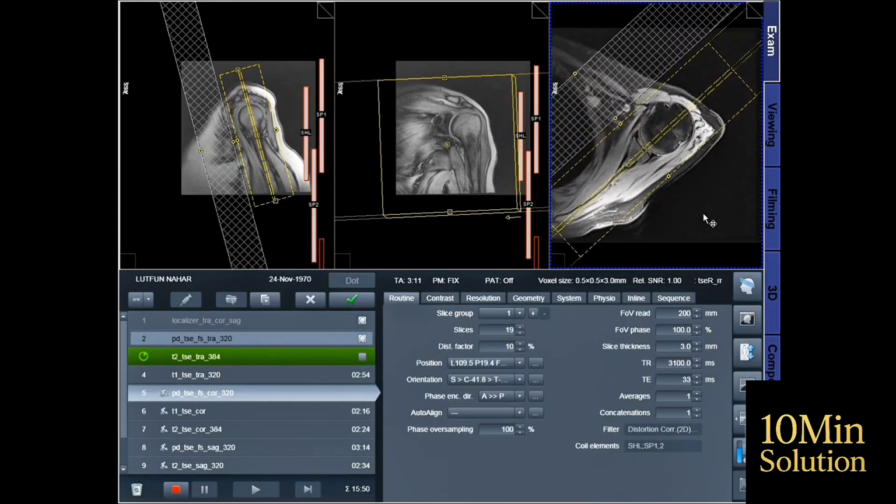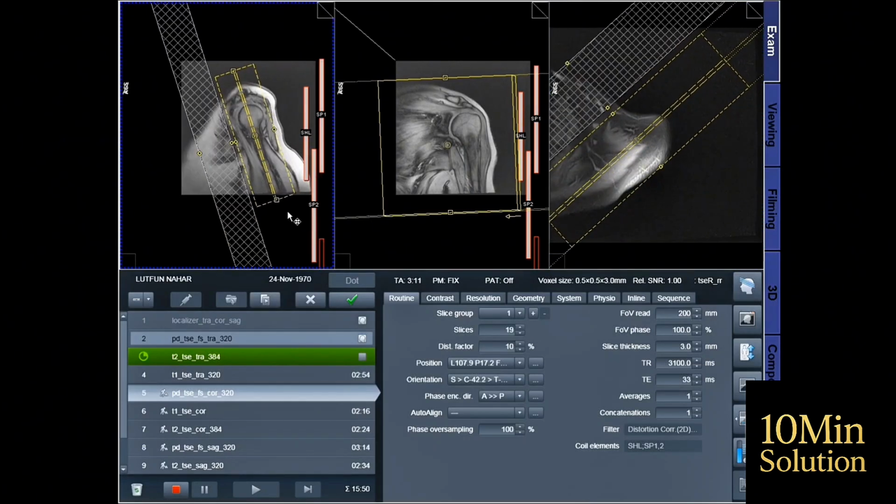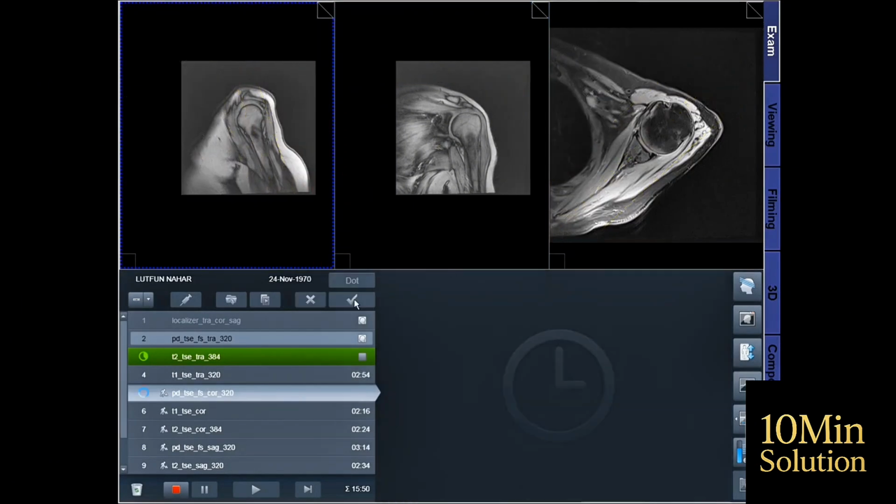So now, since we are doing coronal planning, if we talk about the theory, then it will be based on the axial and sagittal images. See, we have done the planning very nicely by following the anatomy and physiology.